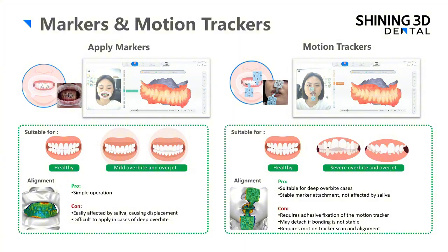if you want to use the motion trackers, not only for the face scan but also for the intraoral scan, that we need to add an extra match data of the motion trackers to the intraoral scan data.